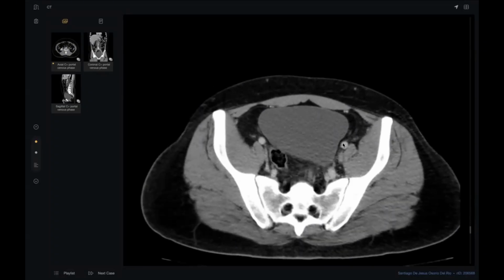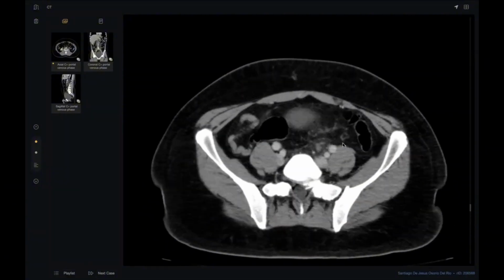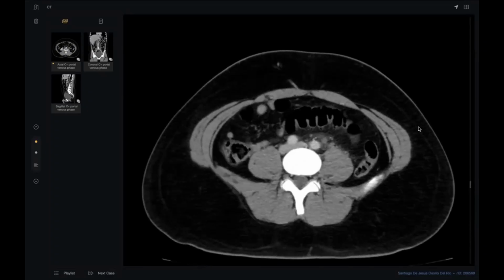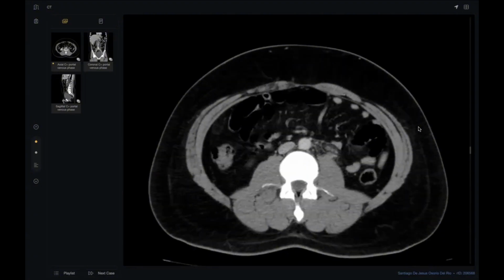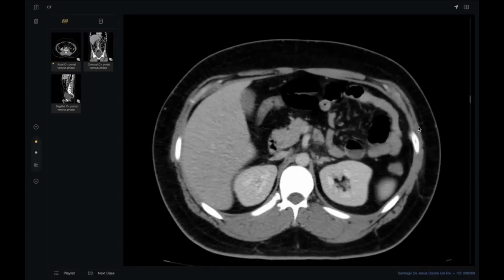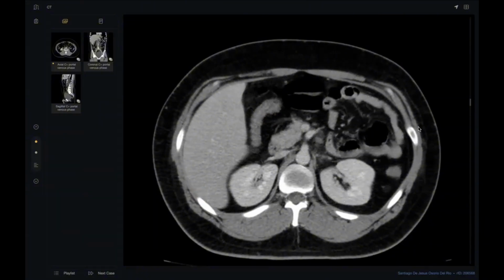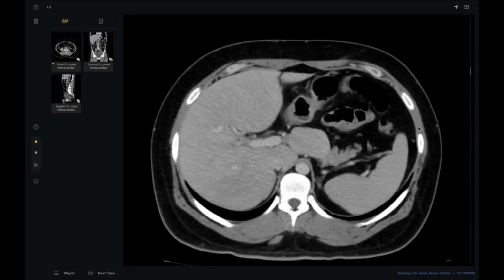one of the branches. Now I will see its origin, from where it is originating. I'm going to trace its location. Now this is the superior mesenteric artery, basically. Are you sure? One second. Are you sure this is the superior mesenteric? Sorry, let me trace it once again.